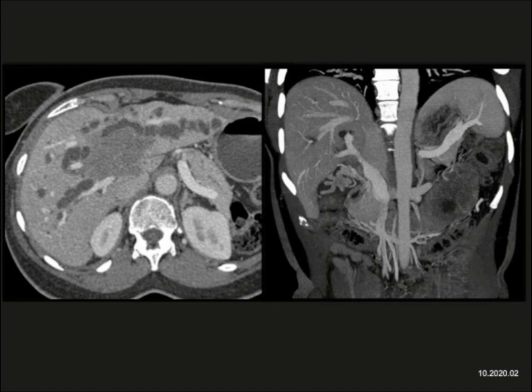Well, tumors that infiltrate into the hilum can also be lymphoma. When you look at the image on the right, the MIP image, you can see the encasement of the portal vein. It's patent, but it's narrowed. And truthfully, cholangios or lymphoma, or in fact hepatoma, can do this. So when you look at the choices, those are 3 good choices. The one thing this is not is simply hepatitis. Hepatitis can cause textural change, but it doesn't cause the mass effect like this.